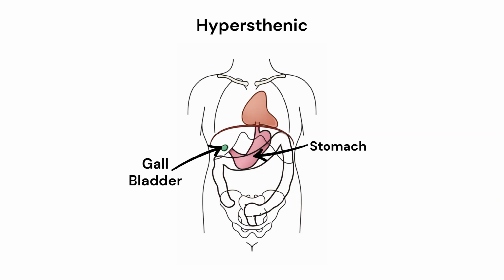From a technical perspective, hypersthenic patients often require adjustments in exposure due to increased tissue thickness. The radiographer must consider adequate penetration while maintaining proper contrast. Collimation should also be carefully adjusted, as organs appear more crowded within a shorter vertical space.